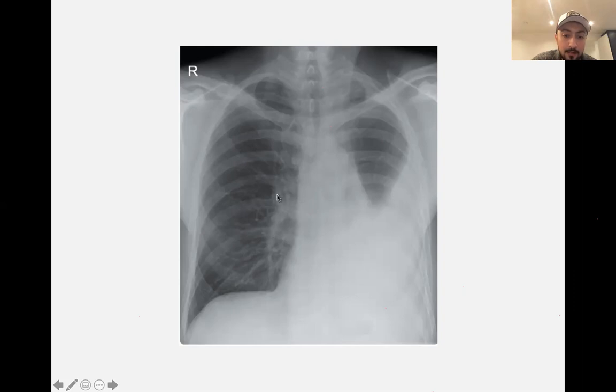Okay. And looking at B, which is the lungs, you can see some hilar opacification, which means opacification around the hilum. We can see some prominent markings around the lungs, and obviously the elephant in the room is this one. Okay, as we said, this is a meniscus sign, which means there's unilateral pleural effusion. If you see this sign, the curved smooth line, and below it you can't see anything, it's totally white. This is basically pleural effusion, which is fluid building up in the pleural membrane. That's why you cannot see anything behind it, and it appears as white. So this is a very characteristic sign of pleural effusion.